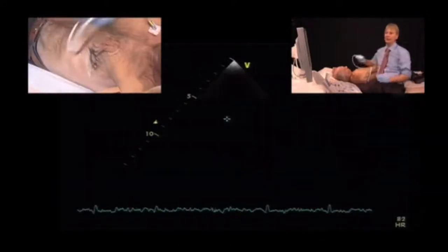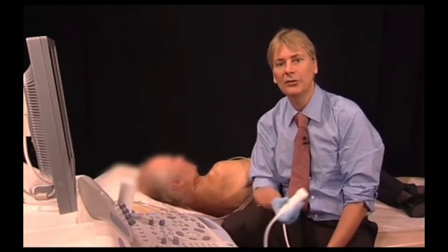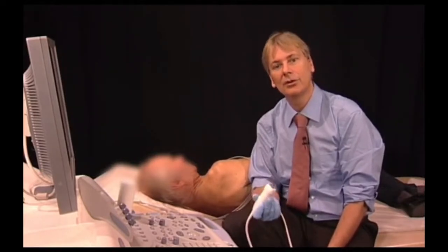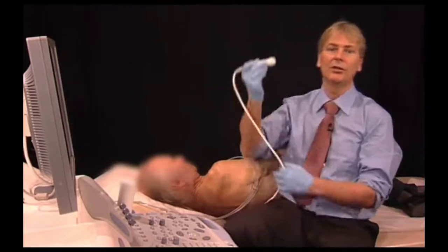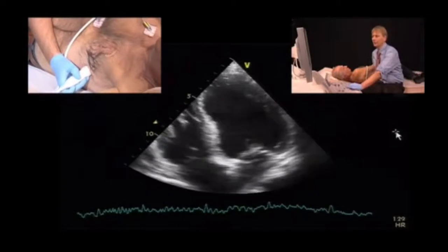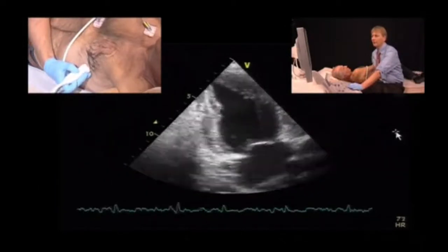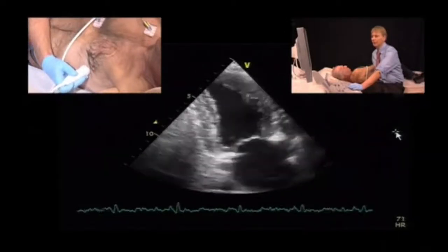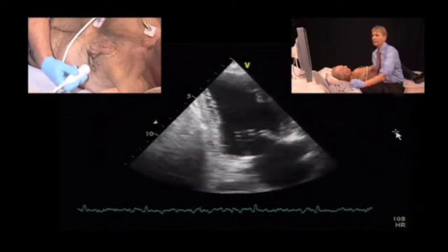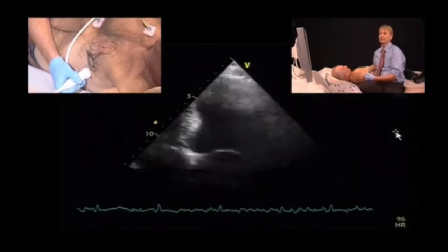And we know from the angiogram that the patient indeed has a three-vessel disease. He has an occluded right coronary artery. He has a critical obstruction in the circumflex artery and also subtotal obstruction in the mid-LAD. So altogether, if we now put all this information together to determine what the global function is, we would probably quantify the global function as mild to moderately reduced, considering the extent of the scar. And the big question will now be, if we revascularize this patient, which portions of the myocardium will then still recover?